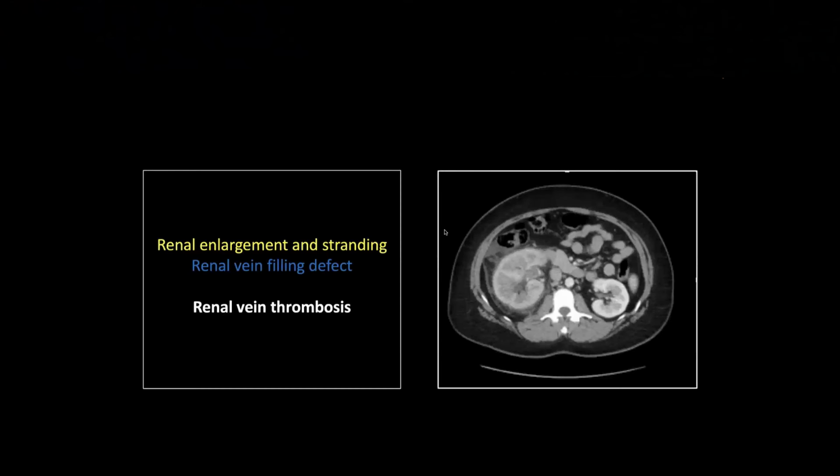All right, nice case of renal vein thrombosis. Of course, you always worry that this is secondary to a renal neoplasm, but certainly bland renal vein thrombosis does occur. It's a lot like portal venous thrombosis in that it often follows on a relatively benign illness where the patient allows themselves to get dehydrated and thus have a predisposition to in situ thrombosis.